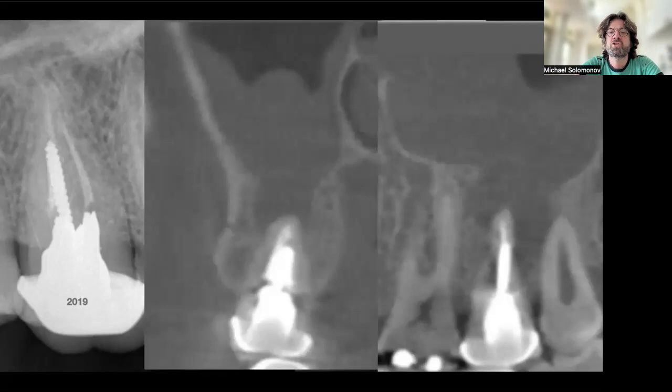And please, an additional example: we see a huge hypodense area that totally destroys the border with the sinus. We have also an apical lesion. We have also odontogenic sinusitis, and again we have a final diagnosis of asymptomatic apical periodontitis, although odontogenic sinusitis is a question.